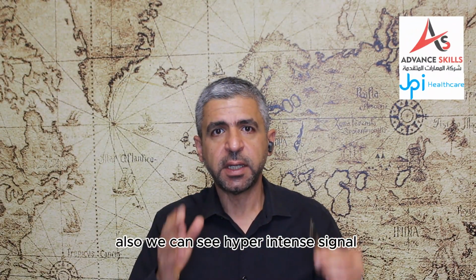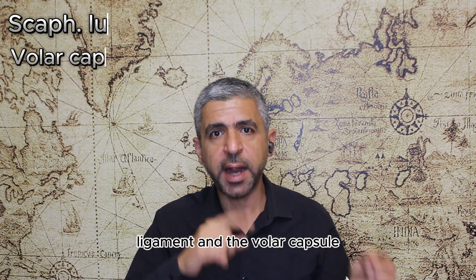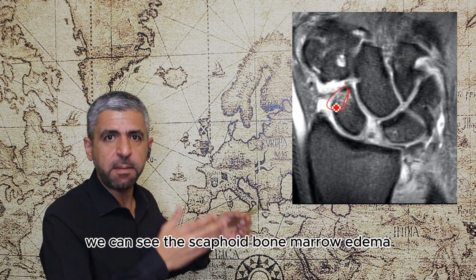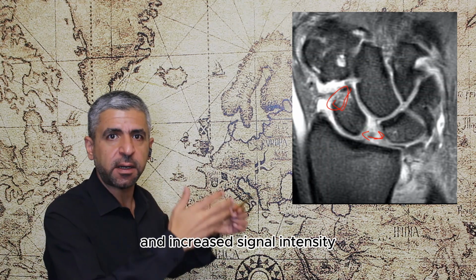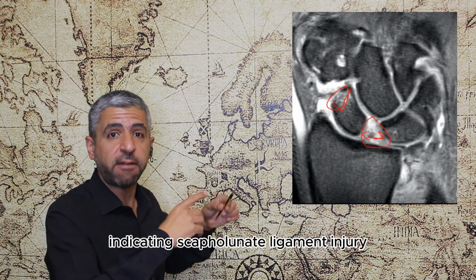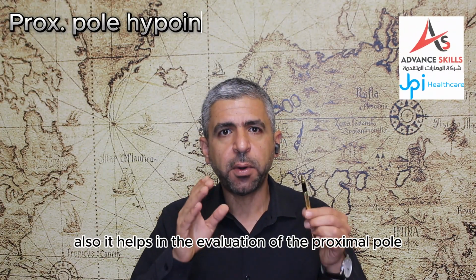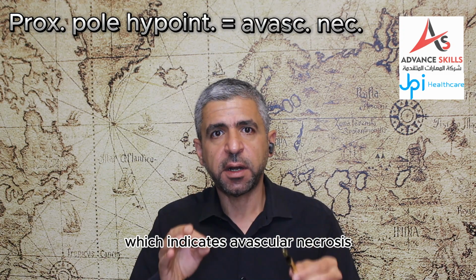Also, we can see hyperintense signal associated with injury to the scapholunate ligament and the volar capsule. Like in this example, we can see the scaphoid bone marrow edema with widening of the scapholunate distance and increased signal intensity indicating scapholunate ligament injury. Also, it helps in the evaluation of the proximal pole hypointense signal, which indicates avascular necrosis.